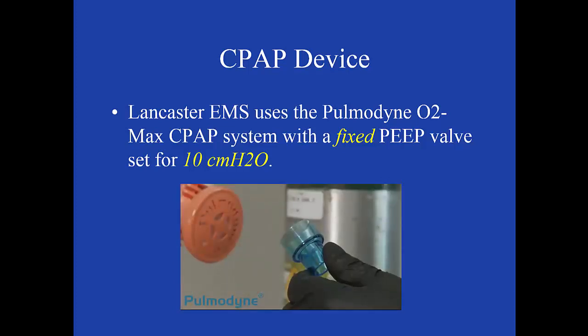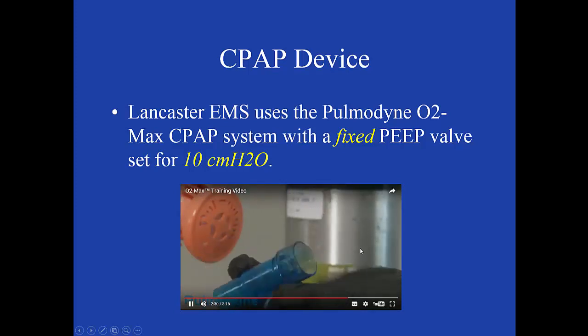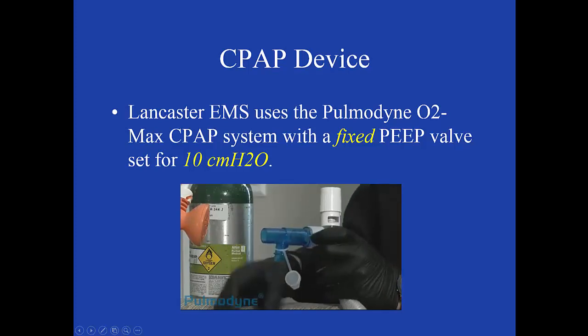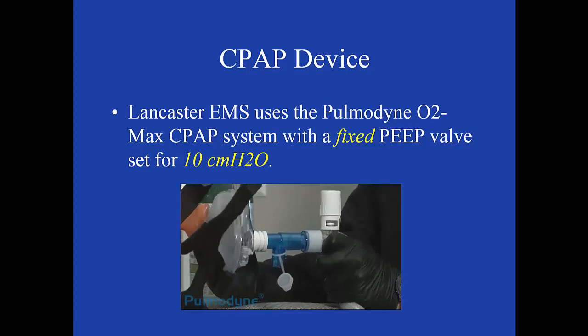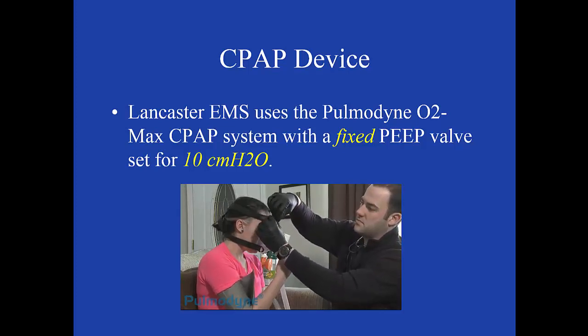Included with the O2 Max system is a 30mm nebulizer adapter. The adapter allows the connection of a nebulizer T-section, which allows a nebulizer system to be mounted between the mask and corrugated circuit.